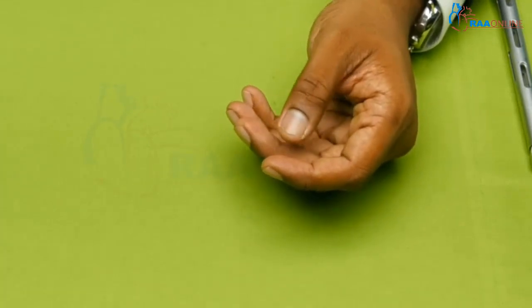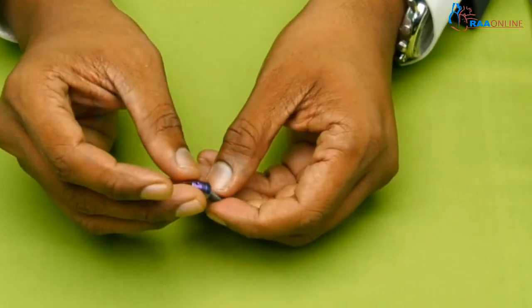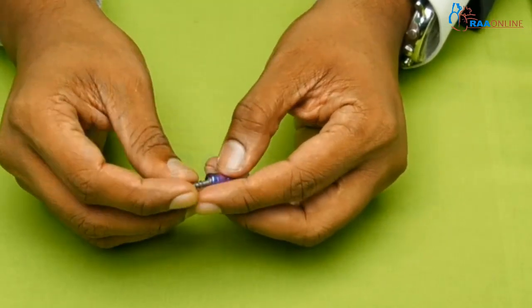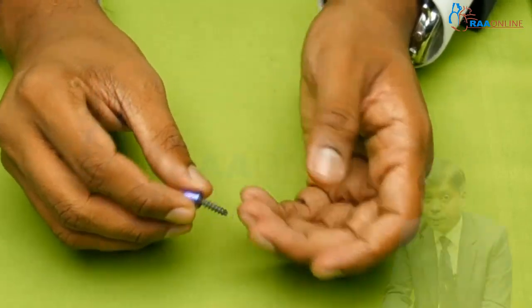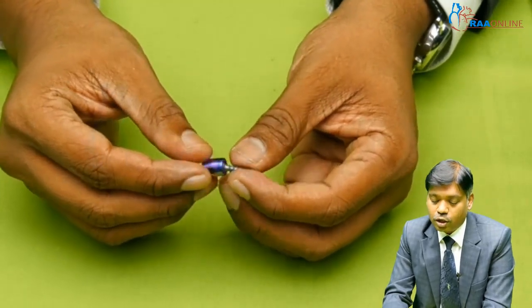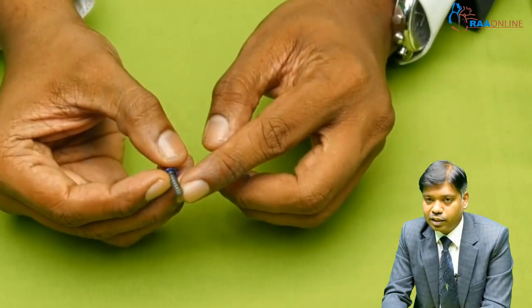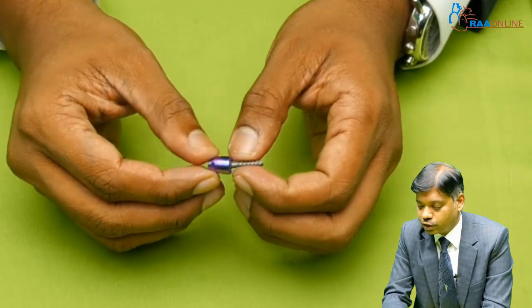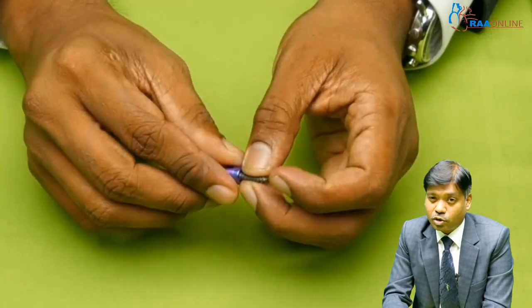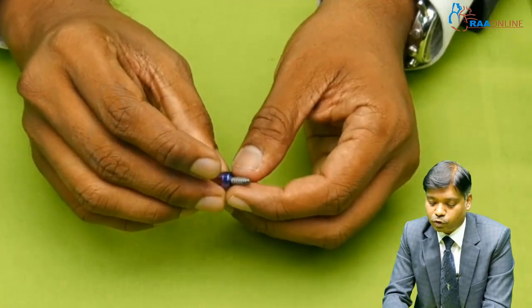Once that is done, you use a polyaxial screw just like this. This is the polyaxial screw, just like in the thoracic or lumbar spine, but you can see the length of the screw is just about 14 to 16 mm. If you are going to use a pedicle screw, you will get a good length. You can go about 26, 28 or even 30 mm, but the diameter is usually 3.5 or 4 mm. This is a self-tapping screw, not a self-drilling screw. But it is always better to use a drill instead of a probe, and in case of cut out, or if you are using a new fresh starting point, it is better to always use a tap before inserting the screw.